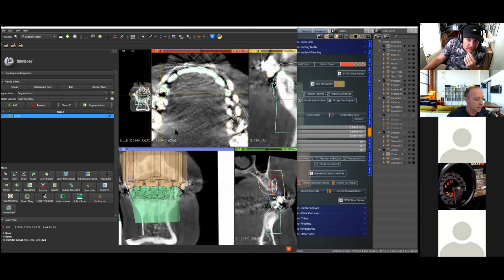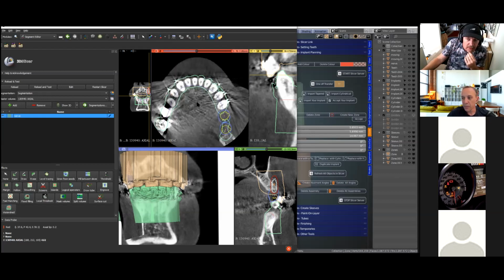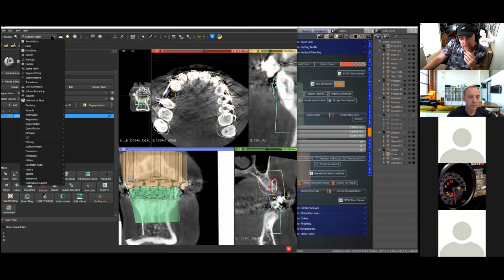Exactly, yeah. Now we're working on the lower curve, and like I've said to you beforehand, we'd like to have an upper curve. So we need to mark it so that our slices can go according to the top one.